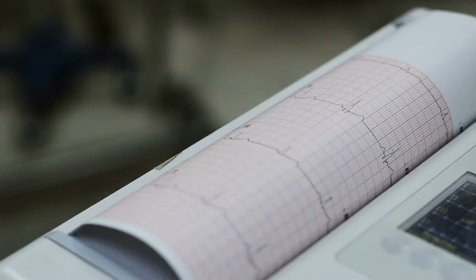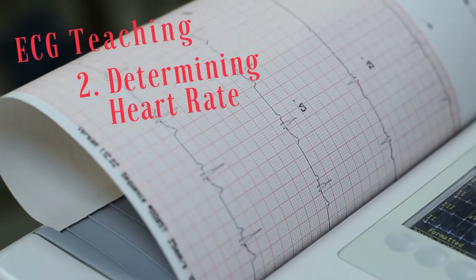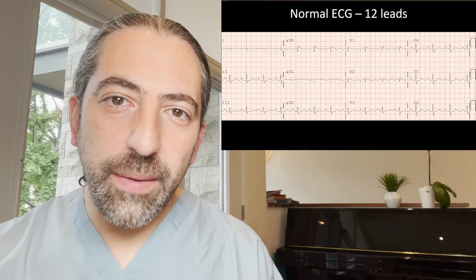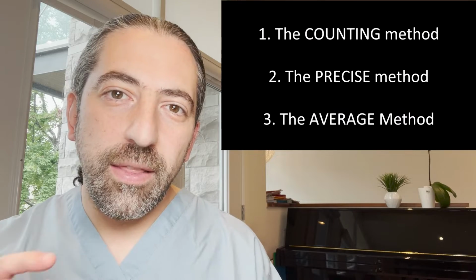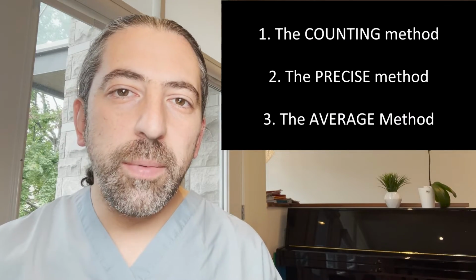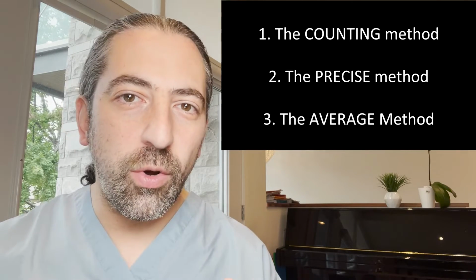Welcome to our teaching channel, and today we'll be discussing how to calculate the heart rate on an ECG. The first step to ECG interpretation is calculating the heart rate. There are multiple ways to do it. I'm going to show you 3 ways today: the counting method, the precise method, and the average method. Most people will use the counting method as their main approach, but it's useful to know all 3 of them.